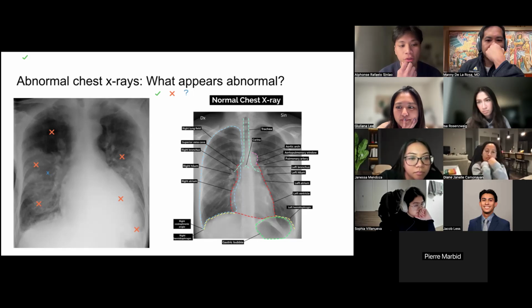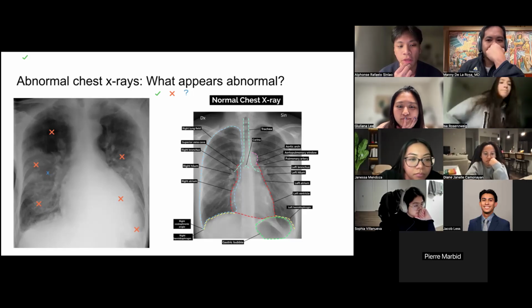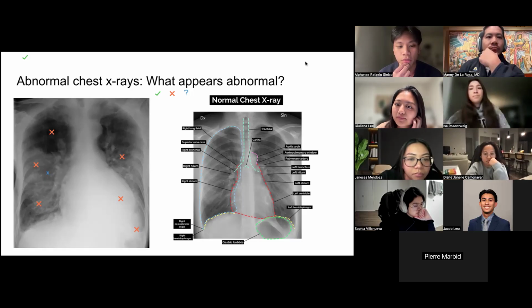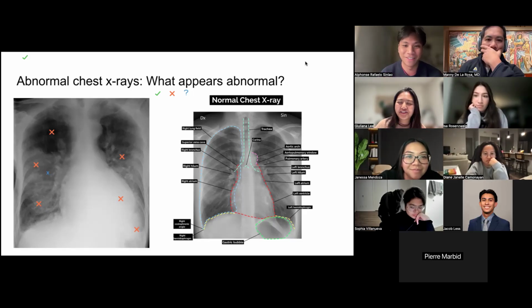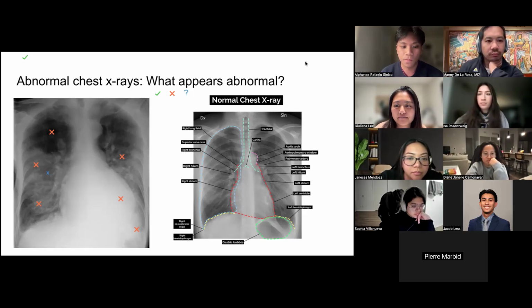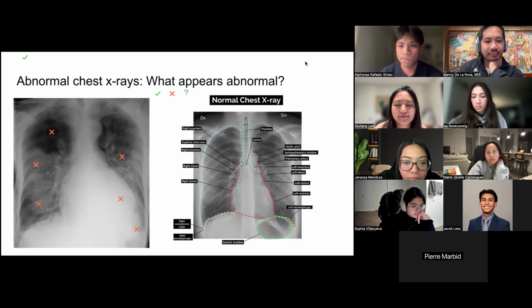So B, we have breathing, so we see diffuse opacities bilaterally. So that could be indicative of fibrosis or something. You can just call out what you see and we'll get to what it could mean afterwards. Wait, you want me to do the rest of the letters? If you'd like to, or if anyone else wants to jump in. Yeah, someone else could probably jump in.